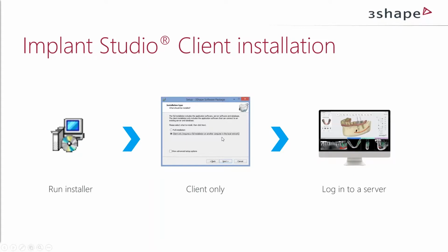I will show briefly the installation process later on. So the dongle is required only on a server PC. The dongle is not required during the client installation. Okay, let's take a closer look at it.